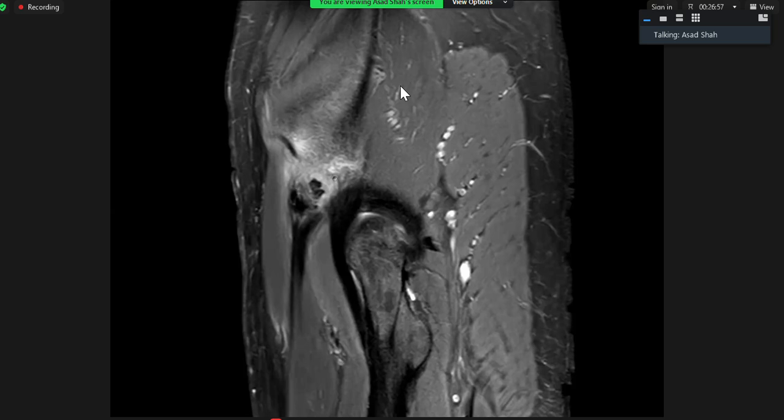Okay. So if I show you that image, the epicenter of it is in the anterior inferior iliac spine, as you said. What is this structure then? This is sartorius. Sartorius comes from the anterior superior, isn't it? Oh, okay, so rectus femoris, I guess. Yes, okay. So it is at the rectus femoris attachment, isn't it? Yeah. So what do you think it is then?